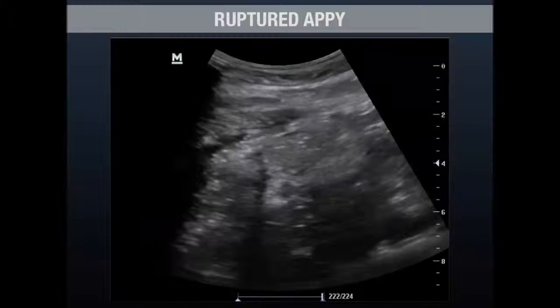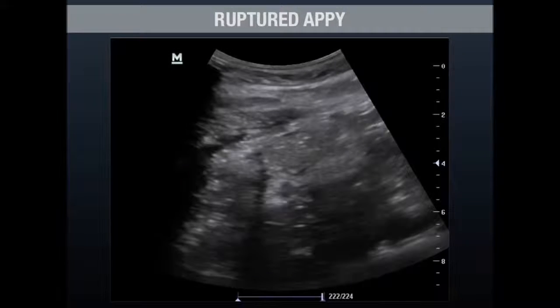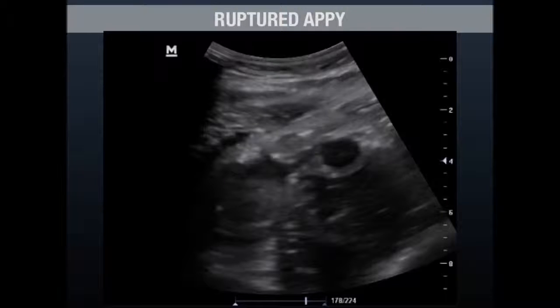This is a patient who had bad right lower quadrant abdominal pain for about 3 days, and then a day before he came in had a brief period where it got better, and then it slowly progressed and got worse again. So this was an interesting patient who actually ended up having a large abscess right next to his appendix, and you can see it in this image here. You can see the abscess walled off, and then you can see it connecting over here to where the appendix ruptured. So this guy, instead of going to the operating room, actually ended up with a perc drain placed in his abscess.